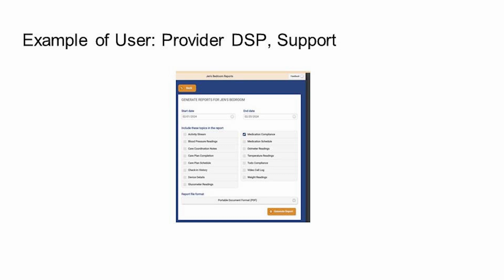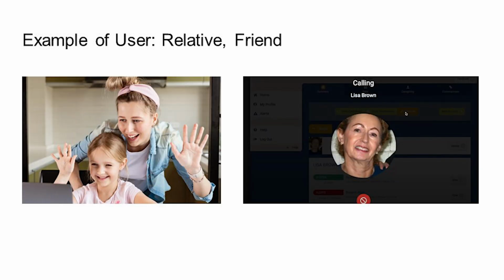There are also the provider direct support professionals or the provider staff who also want to provide service or give care to the members, and they would do that through the portal. If they were to do things remotely, they would need access to the portal, and therefore they too would be users in the strict sense of the word. An example here is somebody who wants to pull up a report for medication compliance would do so in the portal. And what about relatives and friends who want to provide some support?